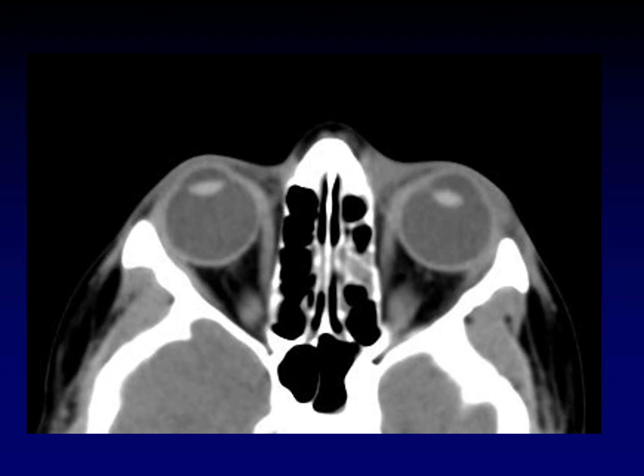This is a very subtle abnormality. Notice on the unaffected side how the lens is completely symmetric with the ciliary bodies anchoring it on either side. Notice in the affected eye here, the ciliary body is intact medially but is ruptured laterally, and the distance between the lens and the wall of the globe is increased.